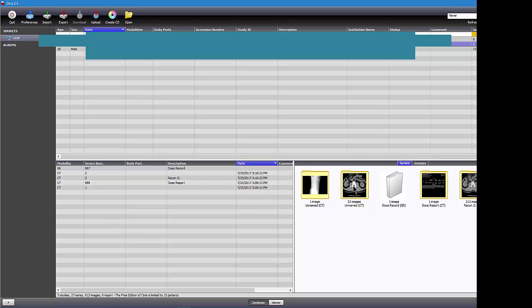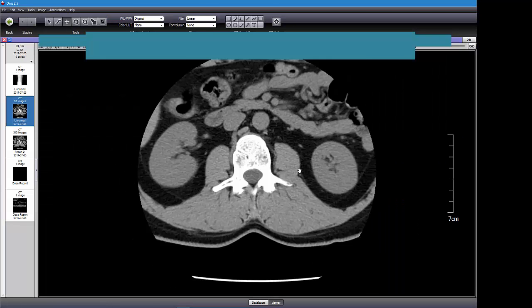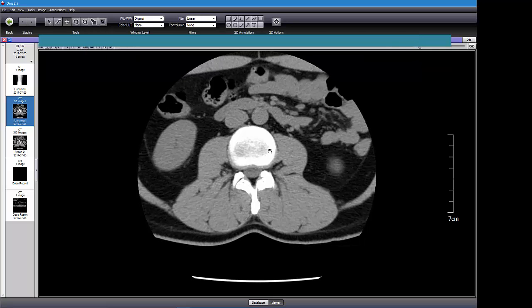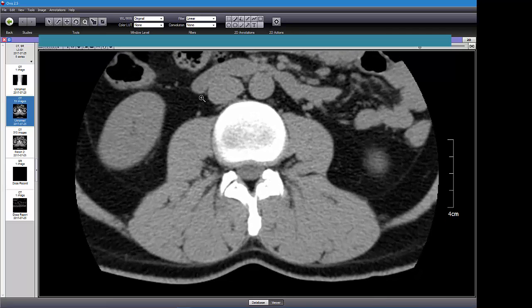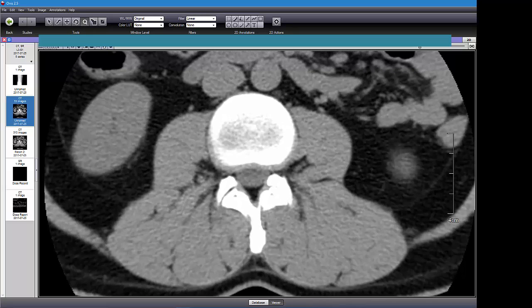Okay, so this is 7/25, 2017, and it's really economical, I don't want to say cheap, but I mean, come on, you got somebody suffering a 2-level fusion. Why in the heck wouldn't you do all the images? I don't understand sometimes.